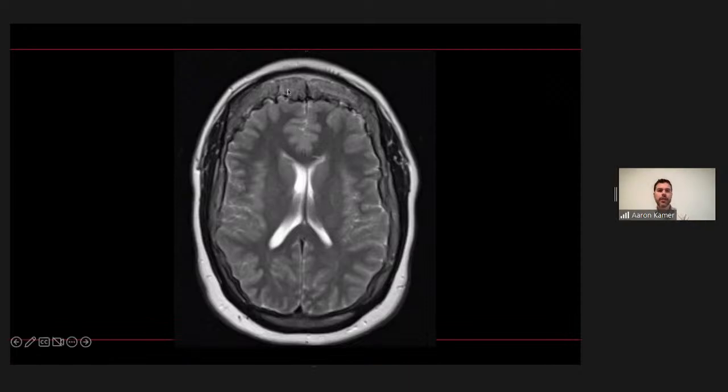I don't see it that commonly in the setting of just brain atrophy. Usually the skull itself stays normal thickness, and doesn't compensatorily thicken if it's the whole brain. I definitely have seen it in the setting of chronic shunting, where there's decreased intracranial pressure chronically, then areas of the calvarium thicken up. But that was not the case for this patient. Any other ideas? There's one other thing: oftentimes these patients, if you look 20 years ago, will have had a normal thickness of the skull.